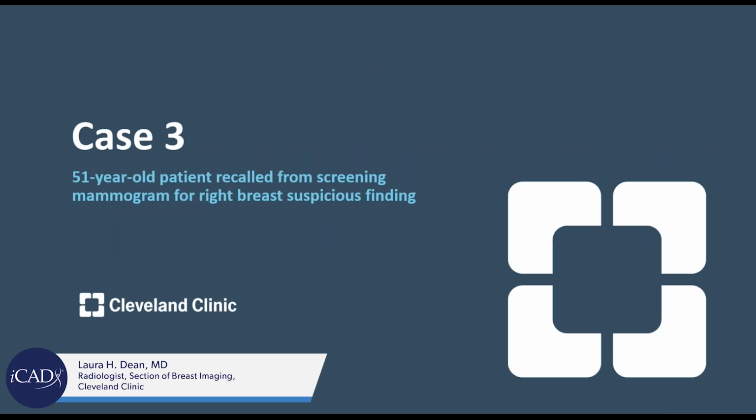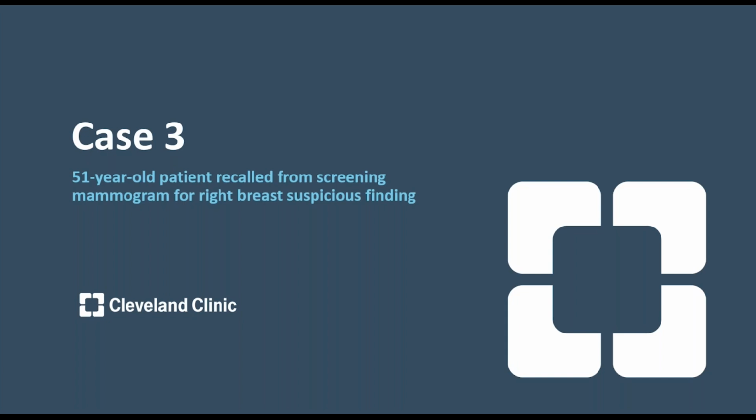So moving on to case 3. This case is a 51-year-old patient who had been recalled from a screening mammogram for a suspicious right breast finding.